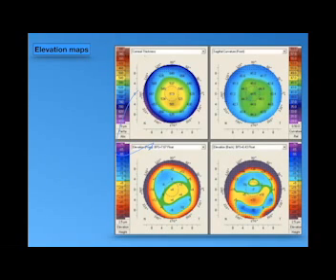A regular, symmetrical cornea, but the steepest K is how much? Say 49. 49, and all figures in the maps are okay, and we assume the corneal biomechanical properties are okay, the patient's age is okay, and the refraction is a high degree of myopic astigmatism, right?